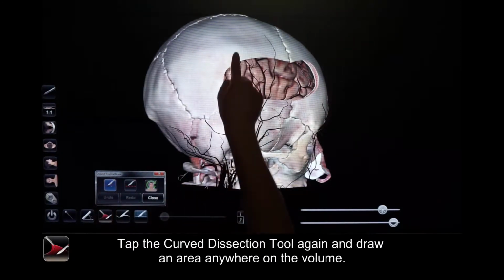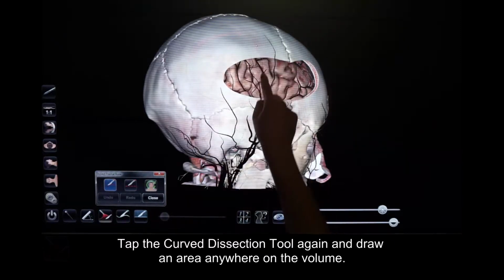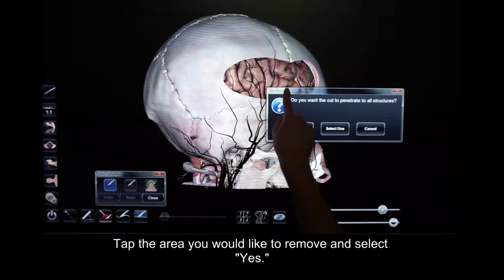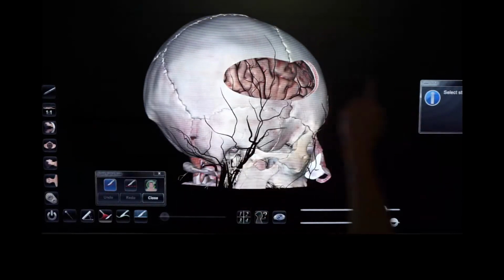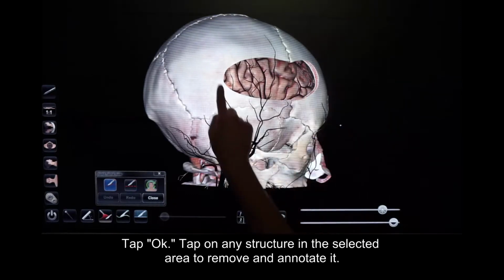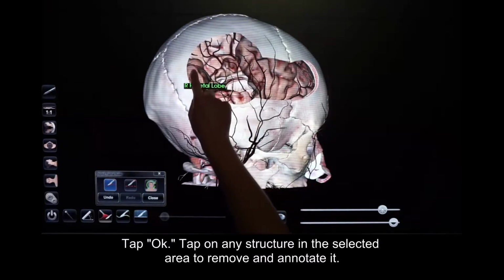Tap the Curved Dissection tool again and draw an area anywhere on the volume. Tap the area you would like to remove, and this time select Yes. Tap OK. Tap on any structure in the selected area to remove and annotate it.